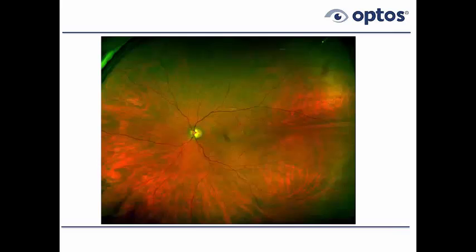associated with glaucoma. Let's look at the left eye. We also have cupping. But the retina itself really doesn't look remarkably abnormal. We're seeing all of these retinal vessels which show up really nicely. In addition, we're seeing choroidal vessels. So this patient could be lightly pigmented, or this patient could be a myope. So we're actually seeing, with the color Daytona image, retinal vessels and choroidal vessels at the same time.